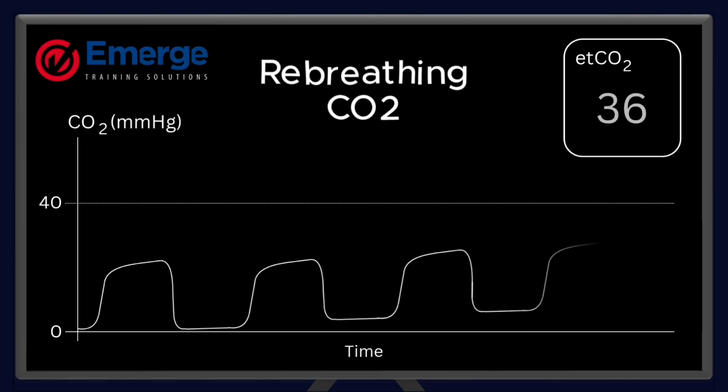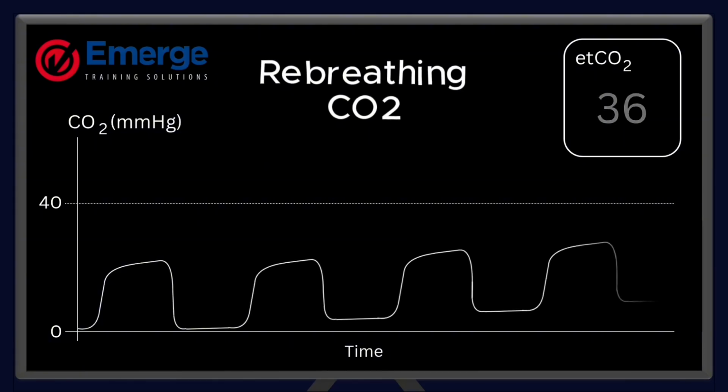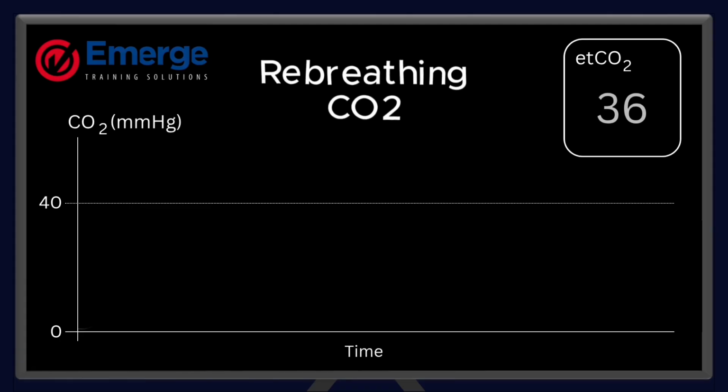Clinically, this pattern tells you the patient is re-inhaling CO2, which will push their arterial CO2 higher and begin tipping them toward respiratory acidosis if it's not corrected quickly. Your mind should immediately go to airway mechanics.